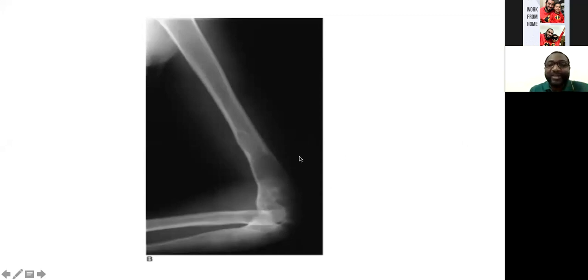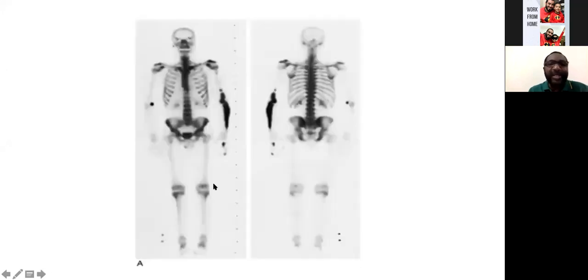The most significant differential in this patient is fibrous dysplasia, all right? And fibrous dysplasia is one of the benign bone tumors that has an intense uptake. So the idea of doing a bone scan in this patient is to see the degree of uptake, to choose the site of biopsy, and to see if other parts of the skeleton have a similar lesion. So this patient had a radiograph, and look at this large lytic lesion. The patient had a whole body bone scan. You can see the whole body bone scan of an adult patient, anterior posterior projection, and look at the intense uptake.